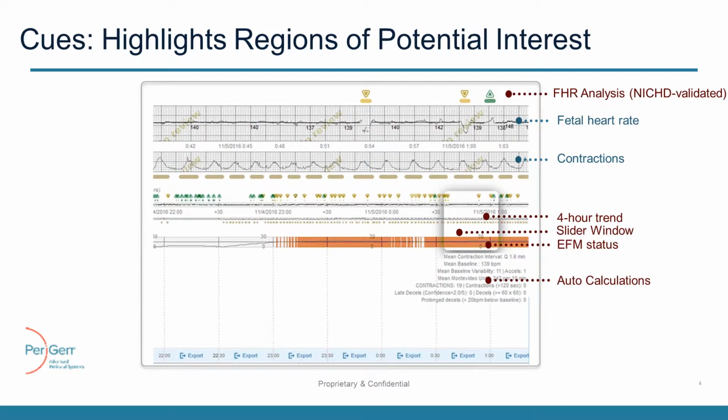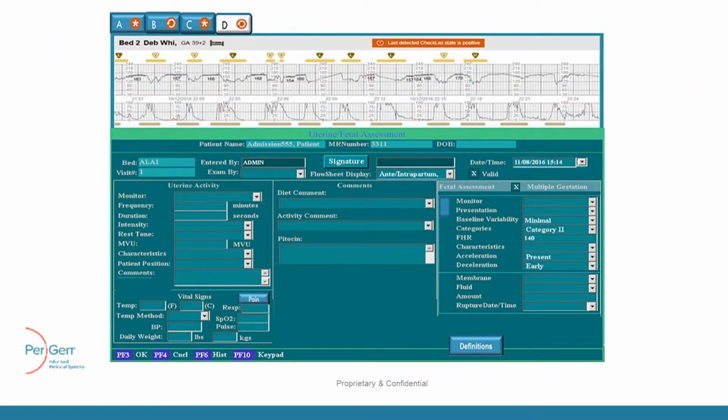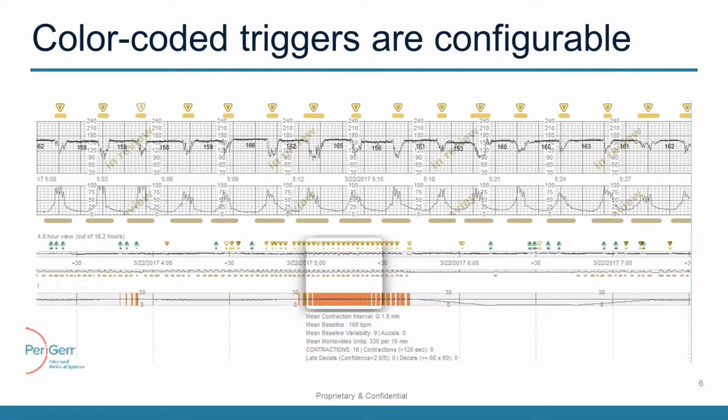Finally, you may choose to export these measurements to your EMR, and you can edit or select some of the tracings or all of the markings to export. So now that we have introduced what cues can do, let us examine some real experience.